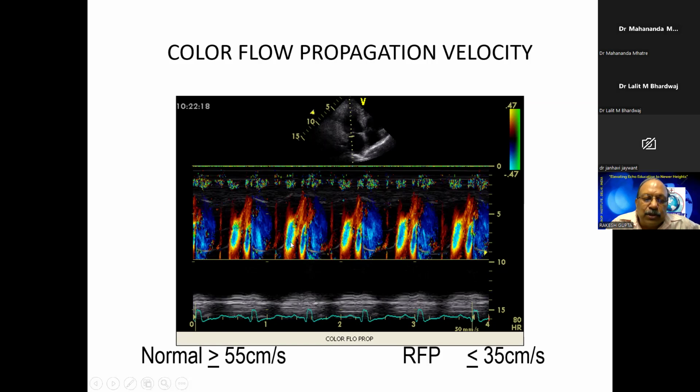This slide shows the presence of E wave and A wave, and this is diastasis in between. Correlate with ECG gating. Here is the end of the T wave and this is the beginning of the E wave, then diastasis, then the A wave, and then the beginning of the QRS complex. And this patient has an MR also. Now this is the opening of the mitral valve. So we go along this red and blue line, start at the mitral valve opening and go almost 4 centimeters up, and then align our line along this yellow and blue interface.